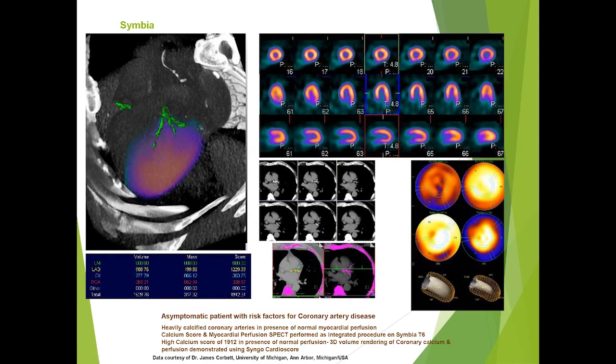Here's an example where coronary calcifications on the CT component can be used either qualitatively, or if we've got good enough CT, used quantitatively in terms of calcium scoring in conjunction with the SPECT portion to improve the evaluation of patients. Now, this can be done better on PET-CT imaging, but nevertheless, SPECT-CT does offer that to some extent.